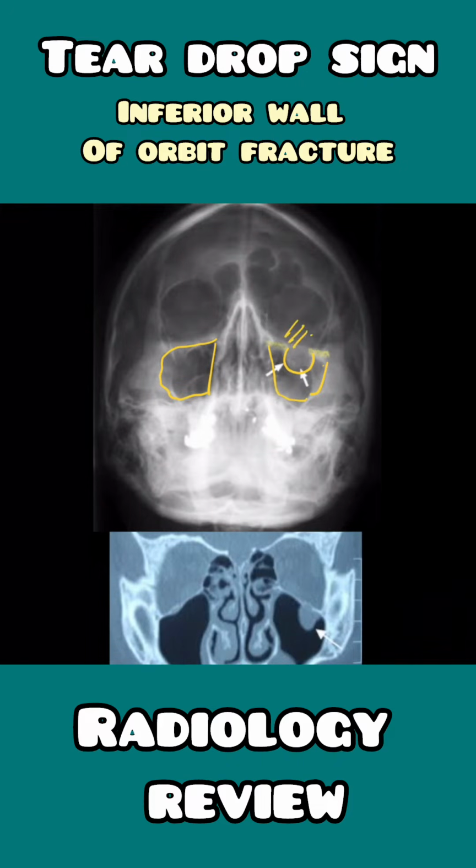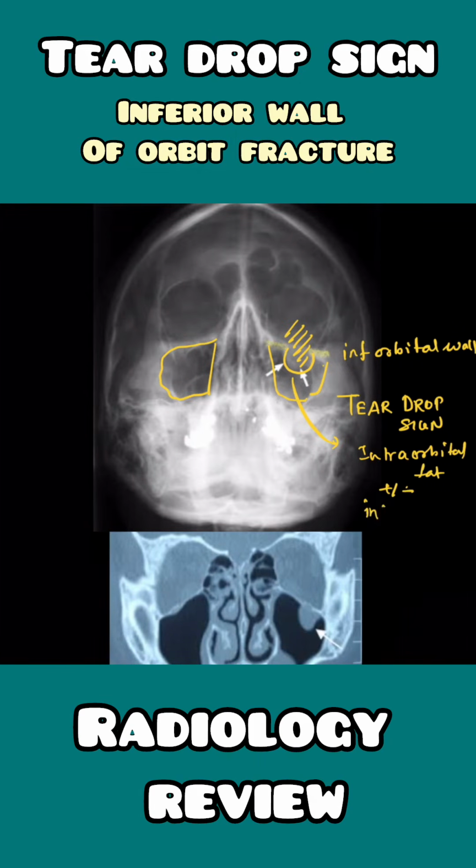Now this herniation of orbital content into the maxillary sinus through an inferior orbital wall is known as the teardrop sign. Now the content over here is mostly the intraorbital fat plus or minus the inferior rectus muscle.